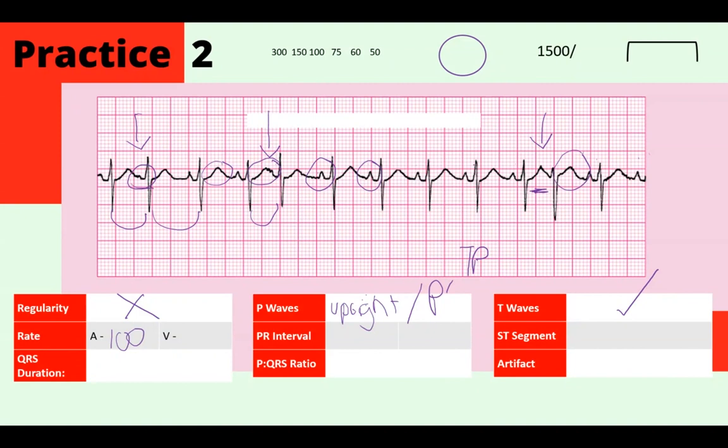So to me, that gives me enough data to support there being P waves in there. Your T wave shouldn't change shape. There's no need for it to, unless it has absorbed a P wave in addition. So I'm going to potentially say it's somewhere between 100 to 130.